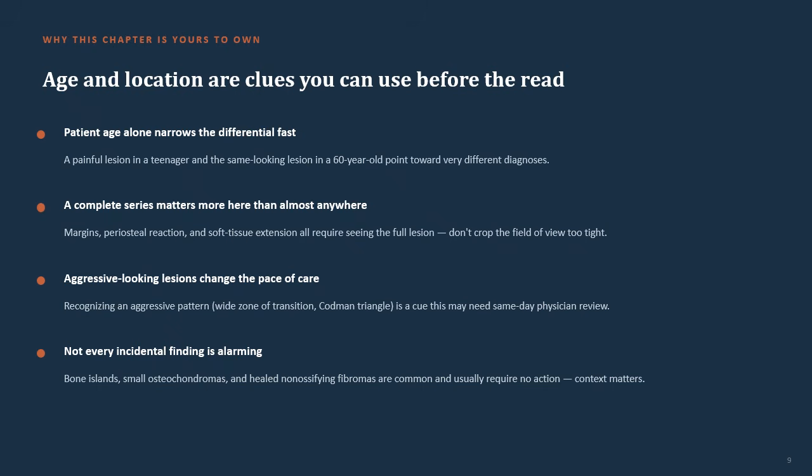So with those images, you're going to make sure that you're getting all of the bone itself in the lesion. So we're not trying to crop really tightly. We want to get the entire bone from top to bottom.